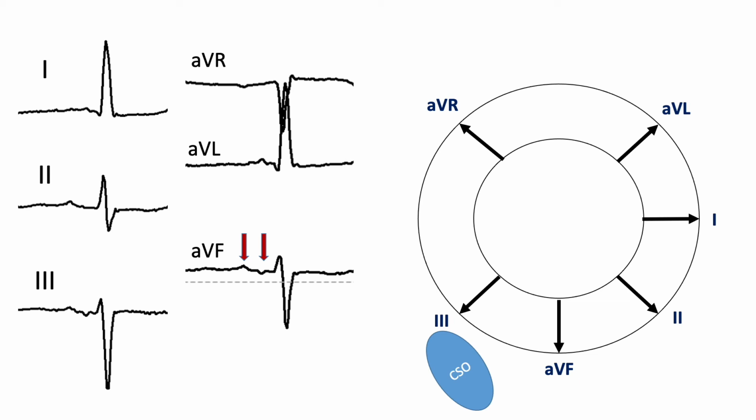At the same time, we look at the P-wave of the left atrium in lead 1 and aVL, and we see that in aVL we have the most positive one, which is actually a finding that we should have expected. We have the most negative one in lead 3. Therefore, we should expect the most positive P-wave in aVL. Therefore, analyzing the P-wave morphology from the left atrium, we can conclude that the right to left activation in this patient only happens through the muscular fibers in the coronary sinus connecting the right and left atrium.